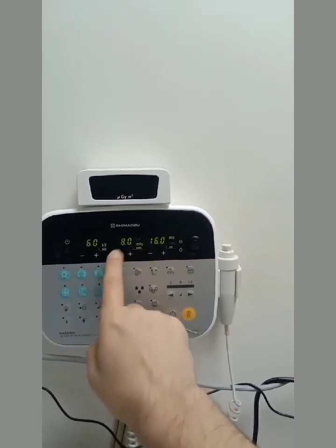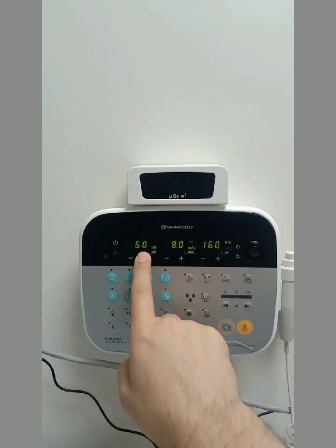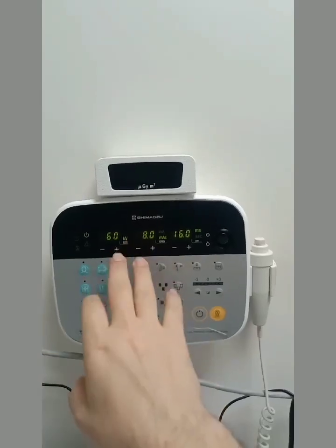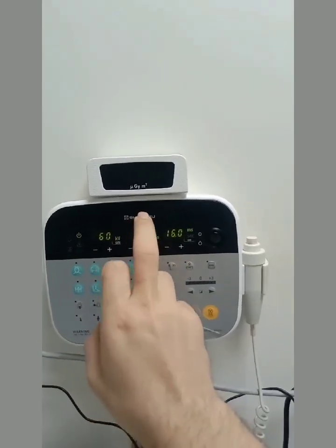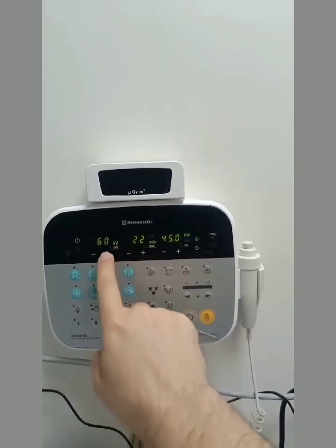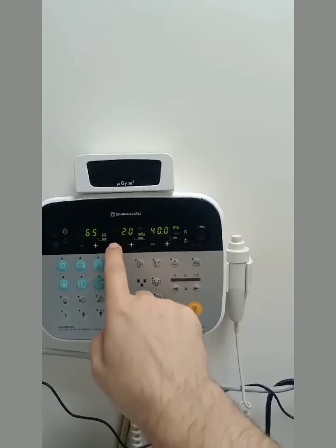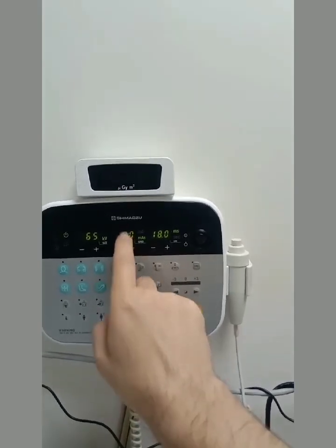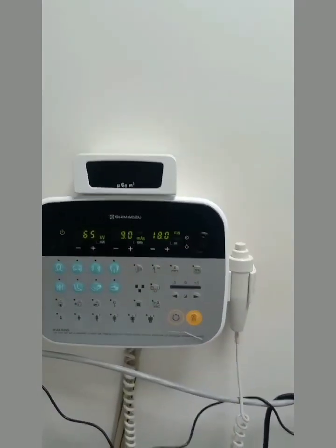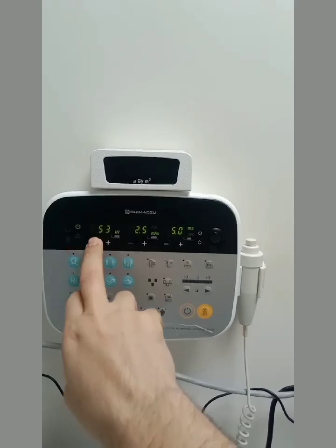Actually, the mA is used for the number of the X-rays. kV is used for the strength of the X-ray beam, how much strength we want to give to the X-rays. This is the quantity of the X-rays, and this is the quality of the X-ray. Here we can increase the quantity of the X-ray, and here we can give the penetration, the power. Okay, so we will keep this minimum because this is the actual exposure. And this is ms, meaning the time, for how much time we want to expose the patient. This is millisecond, so I will set this very little because this is a blank exposure.